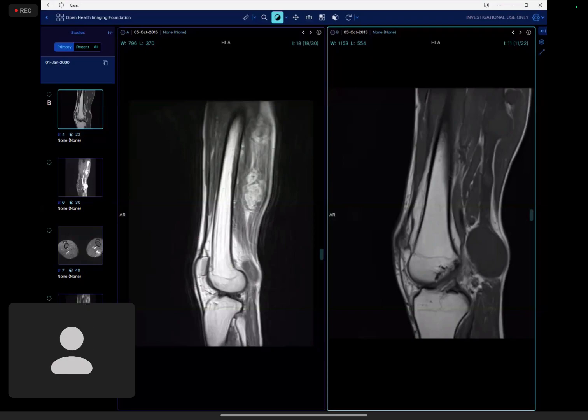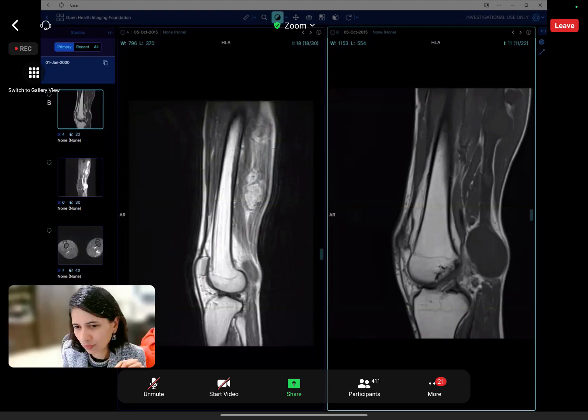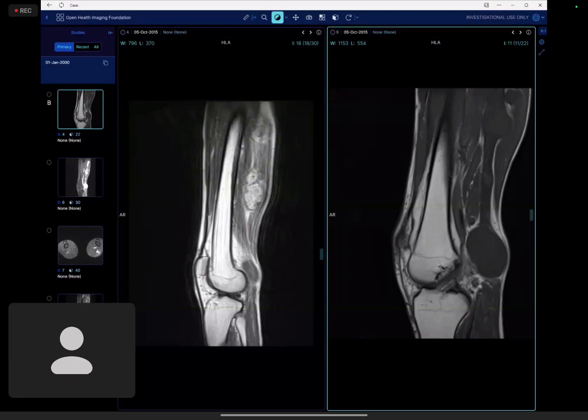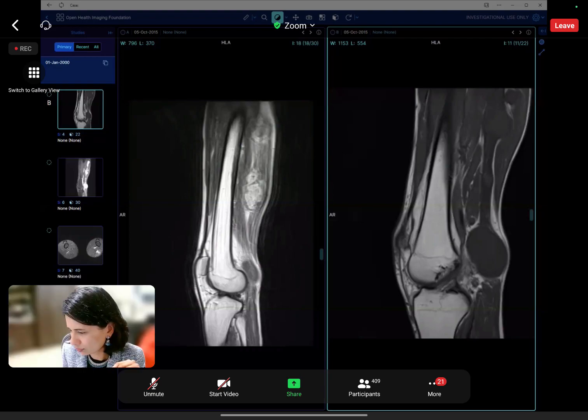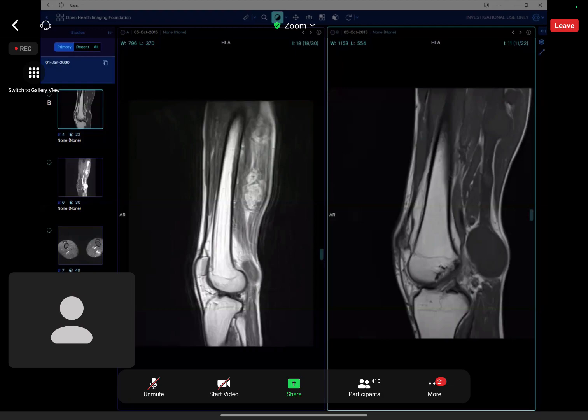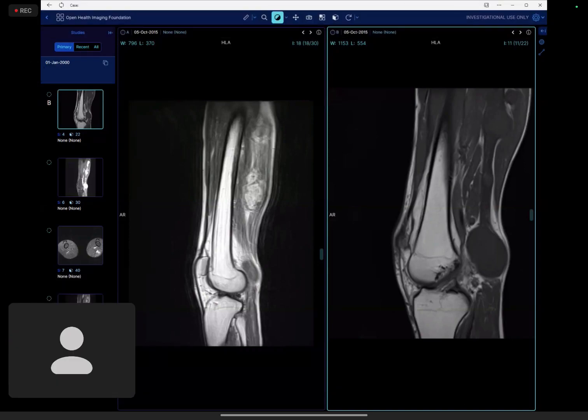But there are no fluid levels within. I would like to check the radiograph to see if there are phleboliths in this region. However, my primary differential would be multiple neurogenic tumors. So I would be worried about neurofibromas, neurofibromatosis. I would like to review the patient's history and previous images to see if there are any similar lesions in other parts of the body. I cannot see any cutaneous lesions in the provided image.